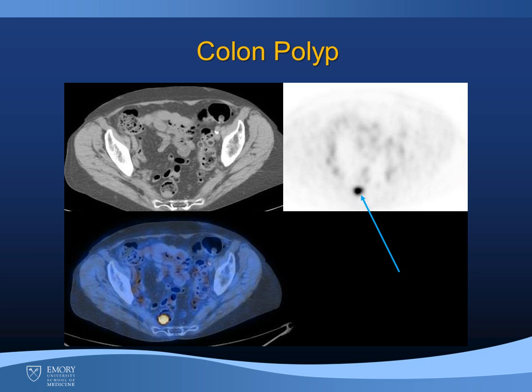Now, this case, on the other hand, there is intense activity associated with a soft tissue nodule, and that is a colonic polyp.